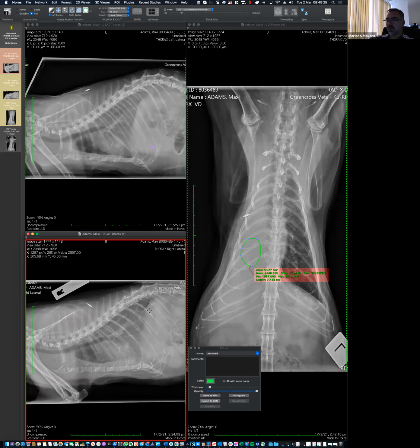So in terms of what seems to be a mismatch, remember that the differences in how much we visualize a focal mass in the lung, depending upon the projection, right or left, rely on the soft tissue mass being surrounded by aerated lung.